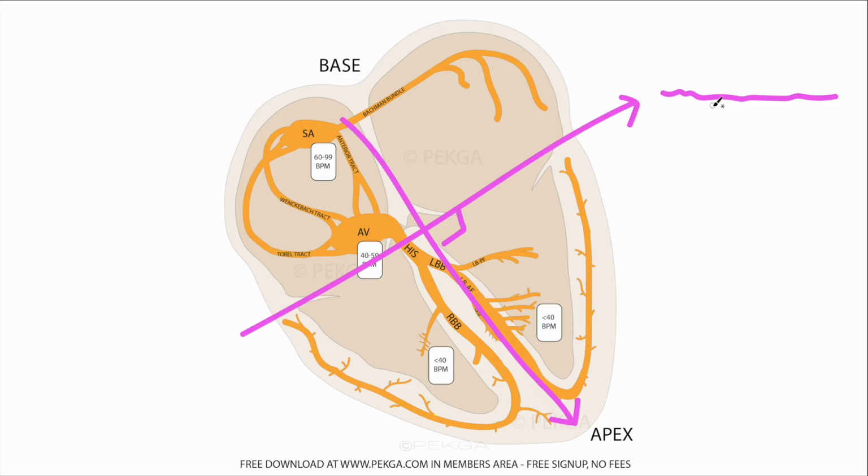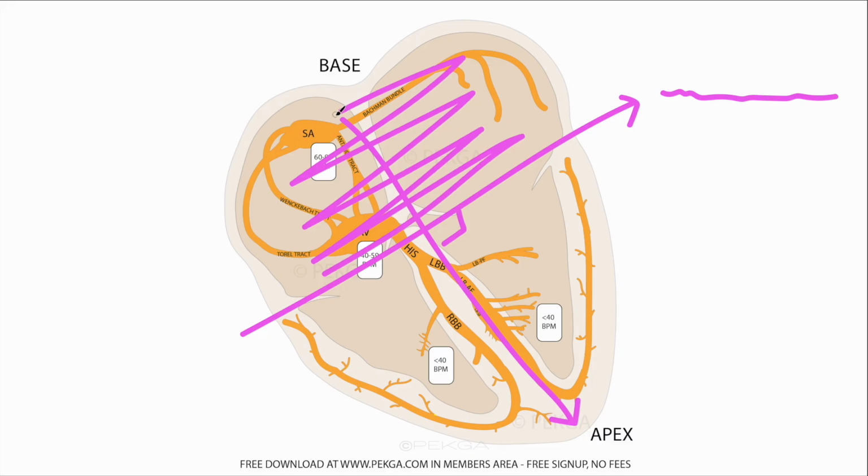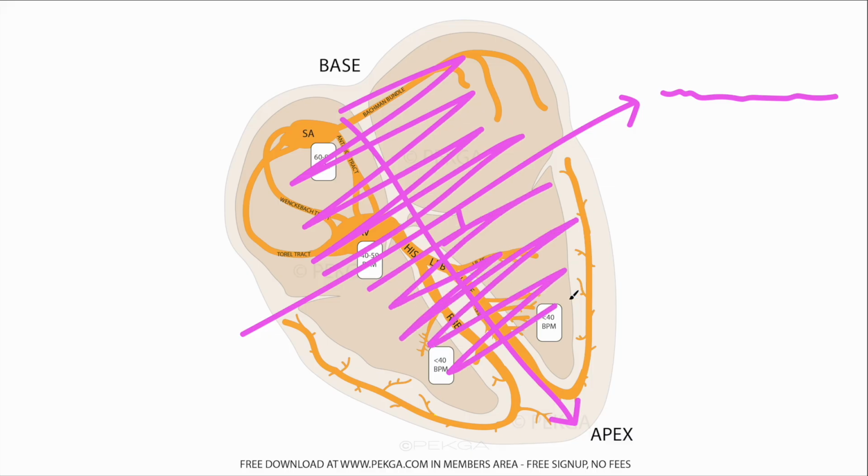So using this isoelectric method, the reason why it's isoelectric is because the activity above this line is negating the activity below this line, meaning that the activity above AVL is equal to what's going on down here, and at this very point, we can expect to see nothing else but this on an ECG.